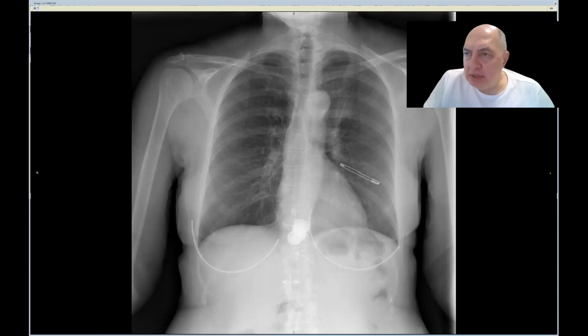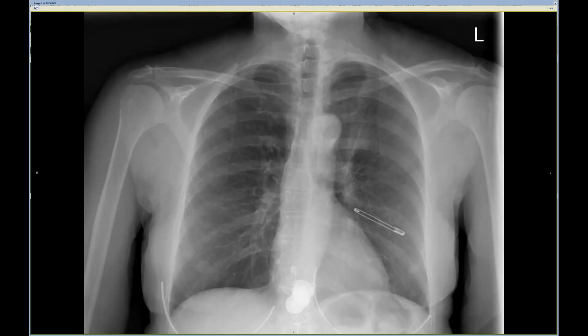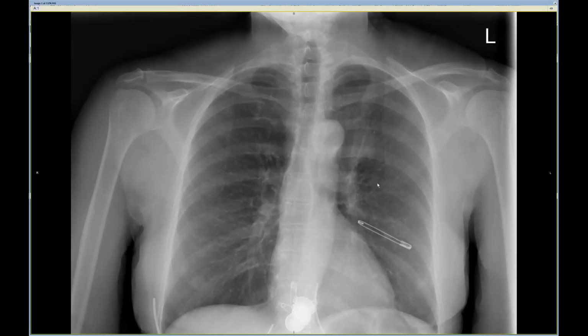So on this latest chest X-ray, we can see that the right lung is normal. You have a right hilum which is quite hard to see, and it doesn't appear bulky at all. And the lungs are nice and dark. However, we go over to the left side.